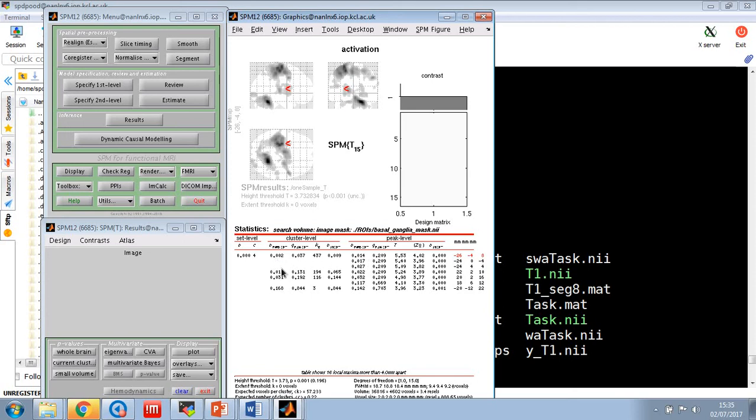You'll almost always have cluster corrected because your ROI is small with respect to the independent units within the image. So the likelihood of a cluster, if there's any cluster, it's likely to extend beyond the boundaries of your ROI, so it's going to be significant. But here you can see there's also one in the other hemisphere. So in that case, because we've used a bilateral mask, you might want to report a bilateral effect within that region. Okay. So that's multiple comparison correction on the basis of peak response, whole brain, cluster response, and small volume correction, which is always peak level, not cluster-based correction.